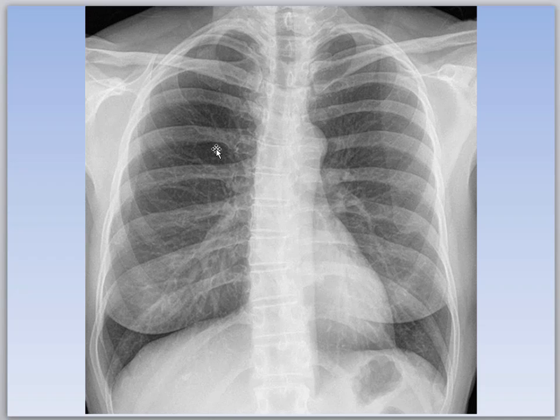You can see how beautiful this image is. You can see the parenchyma of the lung tissue really nicely between the ribs. Now you can see the heart again. What part of the heart did we say this was? The left margin or the left border of the heart. Anatomists call it the margin, the radiologists call it the border. So you can see it quite nicely there.